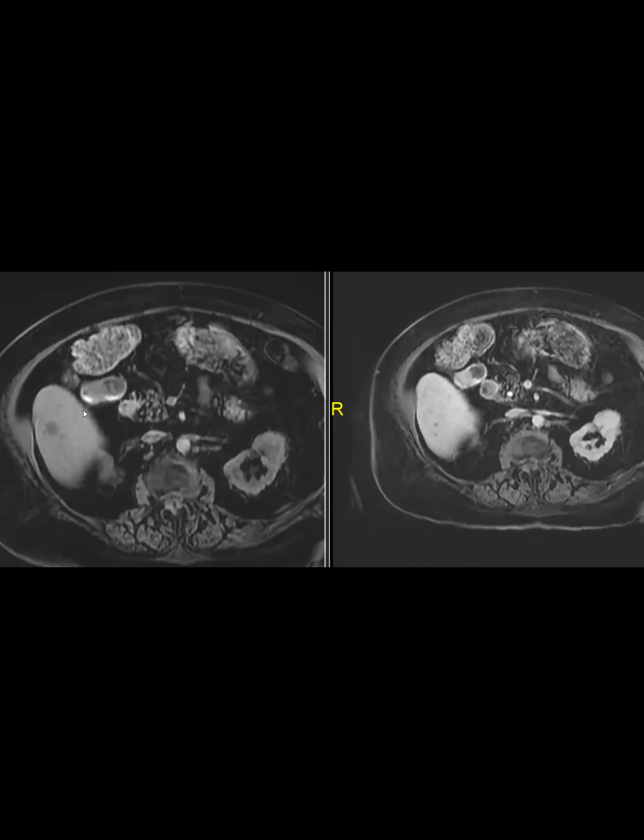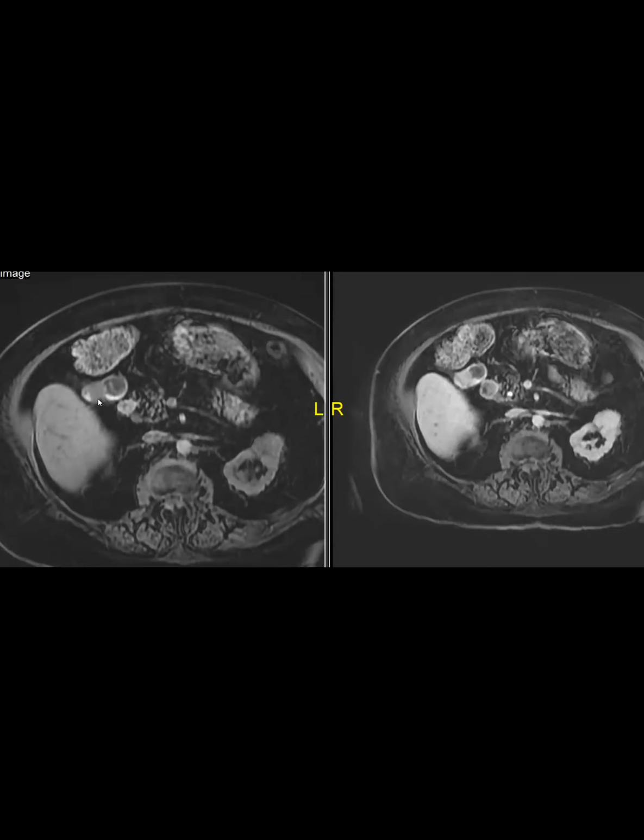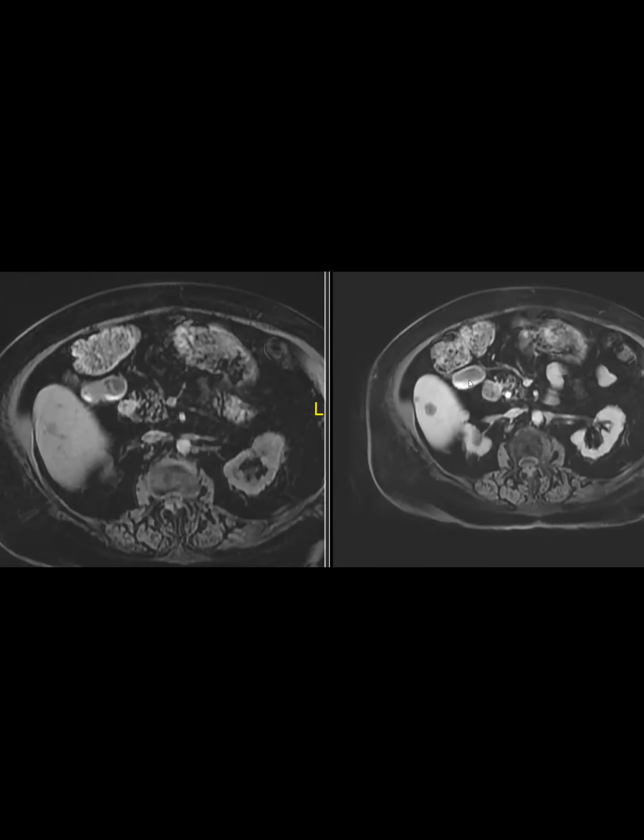You can see maybe this, there's nothing really focal there. So I doubt this is correlated. There's really no correlate there on PET. And you can see here again, the best shot for us to see it was the axial pre-contrast T1, because once we got to post-contrast, you can't see it there. You can see how here it's very easy to mess this up and not see it.